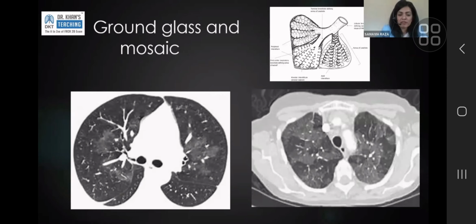Ground glass opacification is not specific to airways. If you look at the diagram of the air spaces, the ground glass change can be the airspace filling up with something. The ground glass change can also be very, very fine thickening of the interlobular septa, but it is so fine that it is not appreciable to the naked eye. So very, very fine fibrosis can look like diffuse ground glass change, and only time and the evolution of that change will tell you what that was.